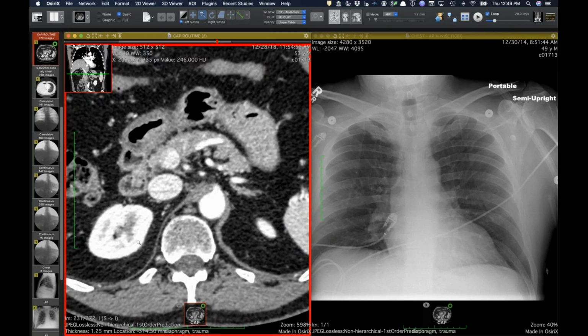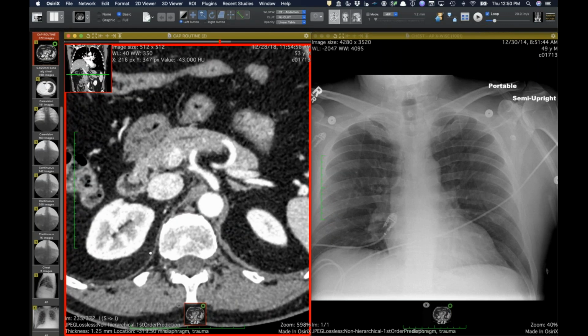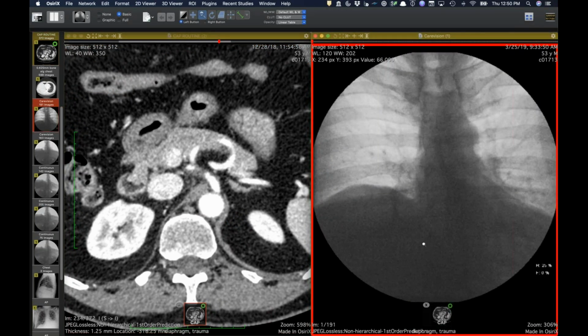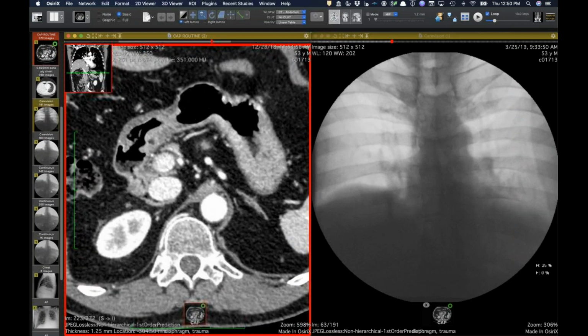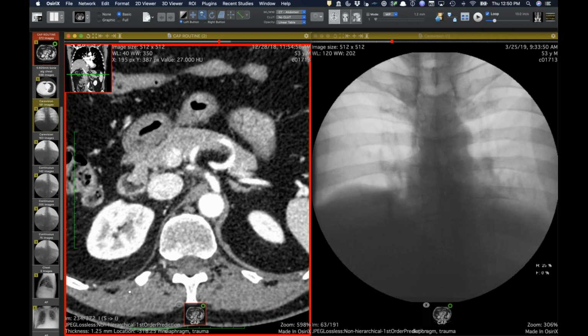Yeah, so the other thing that's helpful just as an eyeball is the right crus is always thicker than the left, and that's not true in your case here. So although this is not as thin as they can be, this is definitely too thin because it's thinner than the left crus. So that's real. And there's some fibers that have survived probably because near the aorta there you still have a nice chunk of diaphragm muscle. So this is probably a weak hemidiaphragm, but not completely paralyzed because there's still some muscle there. It's not thinned out all the way.